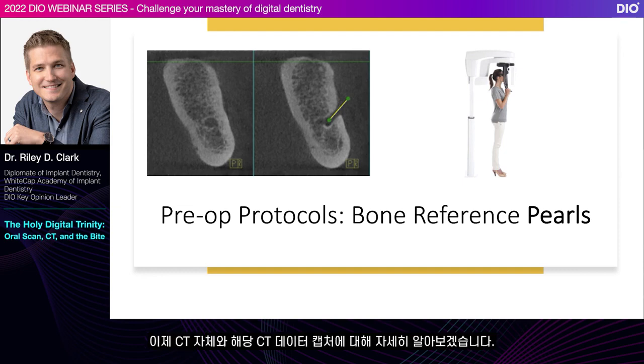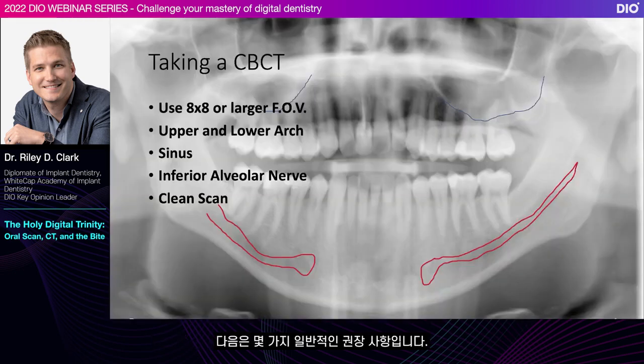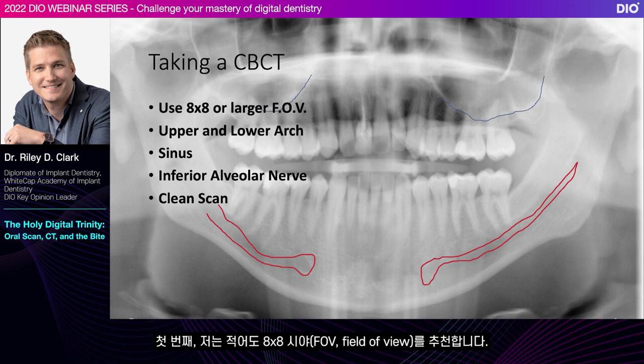Now, let's talk more about your CT itself and capturing that CT data. Here's a few general recommendations. Number one, I recommend at least an 8x8 field of view.